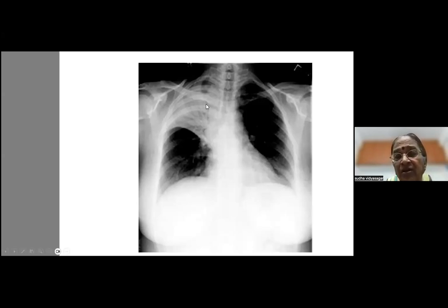It's a lung which is consolidated around this thing. Okay, fine. Somebody is calling it all these things, as no bronchovascular markings. It's a question of the exposure, doctor. So that's why I said, don't expect real life to be ideal, and don't call everything a pneumothorax. If there is a pneumothorax, where is the edge of the collapsed lung? You're not seeing it there, and you've got an obvious thing on the other side. So let's not call this a pneumothorax, this a pneumothorax, and that a consolidation, then he's not alive.